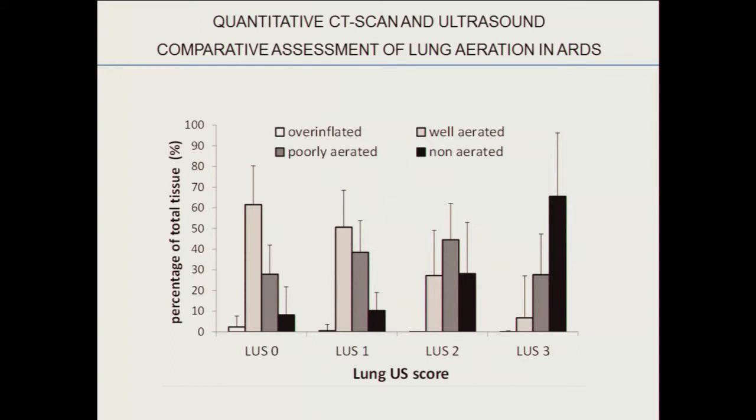And if we look at the regional aeration, you can see that regions with different lung ultrasound score are also characterized by different tissue.